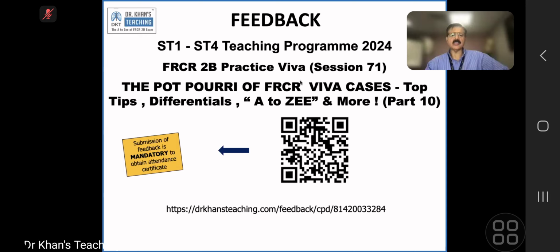In the last case, is there a fistula with the bladder? Yes, there was a fistula with the bladder. And GIST will not be like mucinous carcinomas, not at all. So don't go home with this idea that GIST will be like mucinous carcinoma. GIST will be solid. Even on a CT scan, you will pick them up.